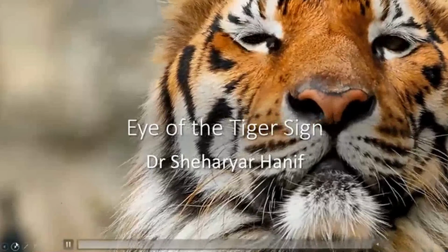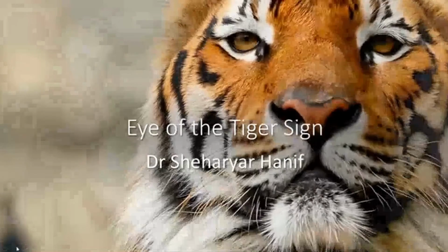So this is 135, eye of the tiger sign. This is a T2 weighted image which shows that there is basically symmetrical bilateral hypointensity, which is usually more likely due to iron accumulation in the basal ganglia, and in between it's surrounded by hyperintensity on both sides, likely due to gliosis and spongiosis. This is a typical picture of eye of tiger sign which can be seen in patients.